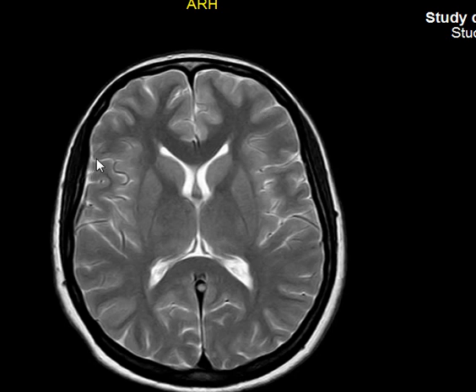Again, sulcus here, sulcus here, between them is a gyrus. Every gyrus contains gray matter and white matter. We have deep gray matter and the cortical gray matter. The gray matter on the cortex is the cortical gray matter, the superficial, peripheral one.